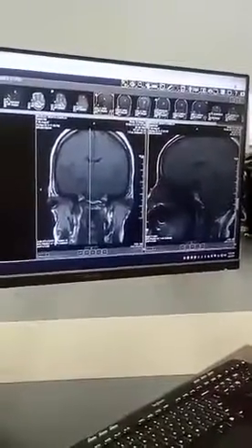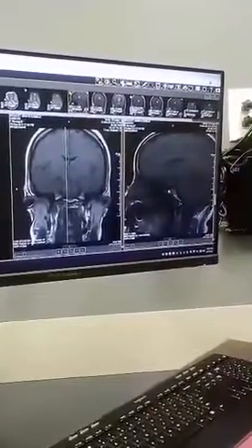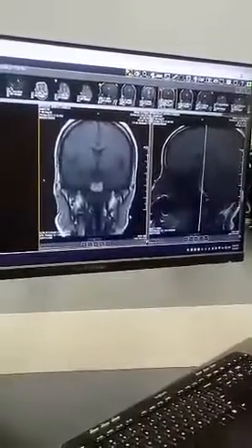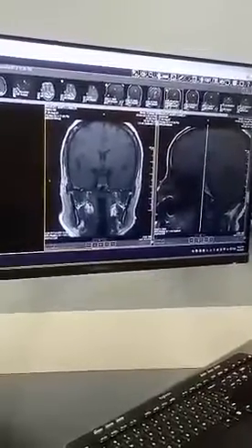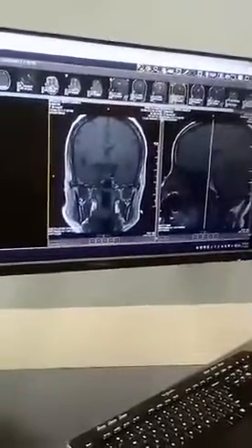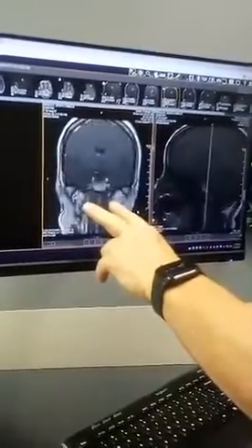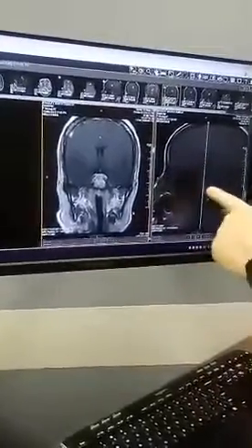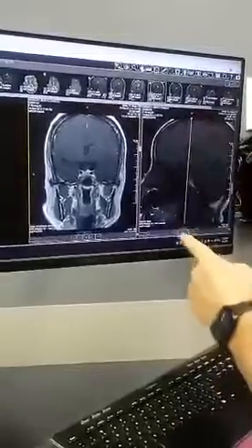Here's your nose. Okay. This is what's called your brainstem. And this is the pituitary. Now, this picture is as if we cut the face away and looking in from the front. So I don't know if it goes far enough out, but eyeballs will pop up here in a second. It doesn't go far enough. But as we move up front, this line tells you where we are. So you can see I'm right smack through the pituitary.